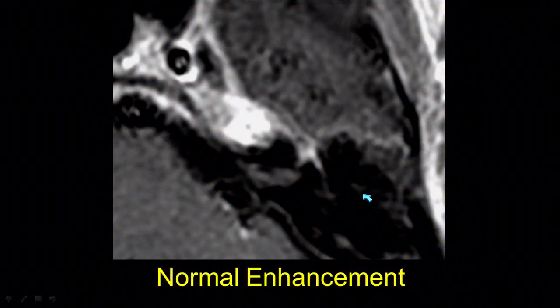Now, we do have kind of a pseudo-lesion of normal anatomy. We used to think that any enhancement along the facial nerve was abnormal, especially when we're just on 1.5T. As soon as I put in our 3T, I was seeing facial nerve enhancement on every case. So we're living in a time that our technology and computers are advancing so quickly, we have to be able to learn, unlearn, and relearn material as we're seeing this anatomy better and better all this time.